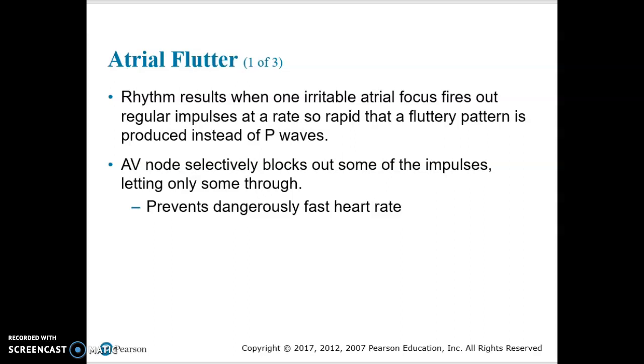Chapter 8, Video 5. Today we're going to talk about atrial flutter in this video. With atrial flutter, we have an irritable atrial focus. So remember, we're talking about an atrial rhythm here. There's a spot in the atrium that's irritated. However, it's not coming from the sinus node.